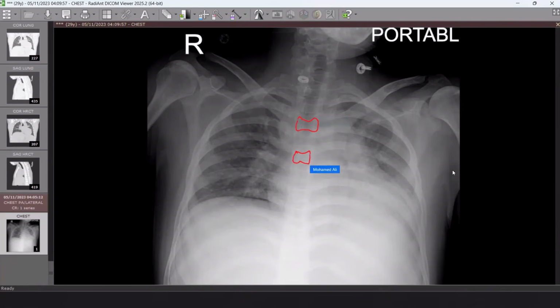No, this one is H-shaped vertebrae. Look for the central depression. What does it mean? Increased bone density with H-shaped vertebrae: we can see this in sickle cell anemia patients. Yes, you are right, this one is sickle cell. Perfect. Sickle cell anemia with lower lung lobe pneumonia.